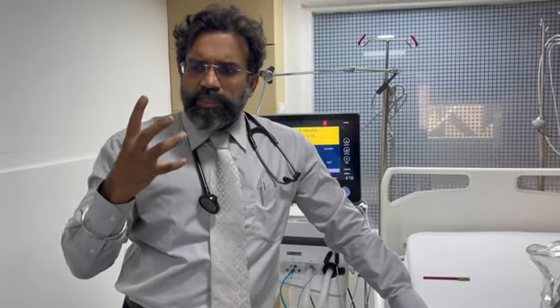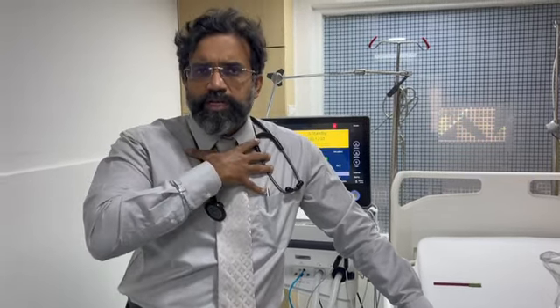Now this is the difference when you use this versus the mask. In the mask, the entire mask very often leaks, whereas here this is almost leak proof because it snugly fits around the neck and prevents the escape of air, number one. Number two is the mask is a rigid structure. So if the patient takes a very high breath above the peak inspiratory flow, then there would be air hunger because it's a fixed amount of air that is over here.